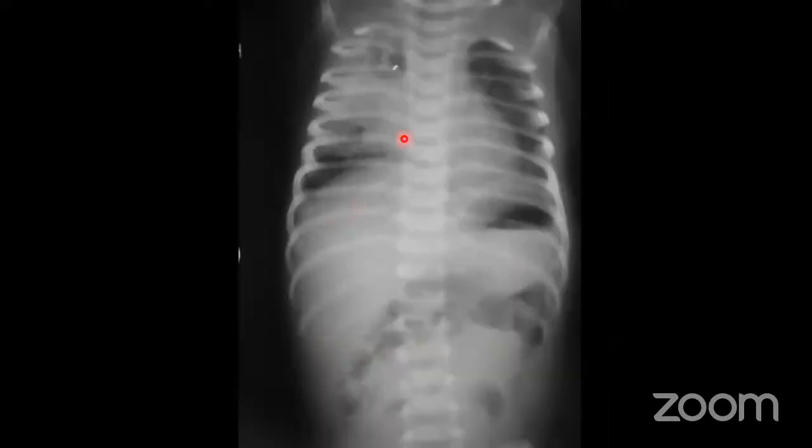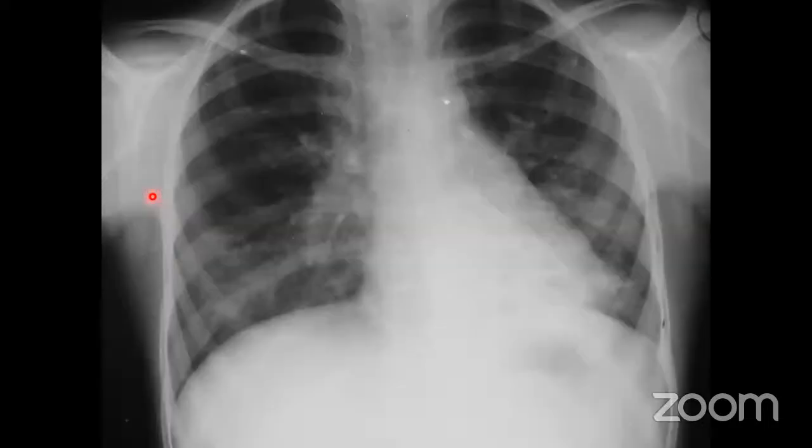So what is this? Again, lobar pneumonia, but here we can get a very beautiful finding, a radiolucent pocket. So this is a case of pneumatocele. Pneumatoceles are generally seen in cases of Staphylococcus aureus, Streptococcus, E. coli, tuberculosis, something like that. But here the lower border is sagging. This is the classical radiological picture of Klebsiella pneumonia. If you look carefully, your eye must be ready.